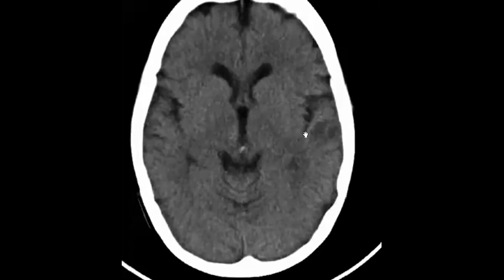So okay, Nermeen, I see that you just started to describe this lesion. So, hypodense lesion. Marwa also the same. Nice. I mean that at least you can mention that it is a hypodense lesion here, and you will start to think about some differential.